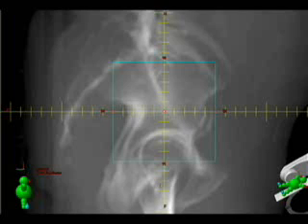Looking at this right lateral DRR, we can again visualize two planes of orientation, albeit differing from the previous AP DRR. We have superior, and here we have inferior. On this side we have anterior, and on this side posterior. This is why an orthogonal set is desired. With angles that are 90 degrees apart, you can find your place in 3D space.